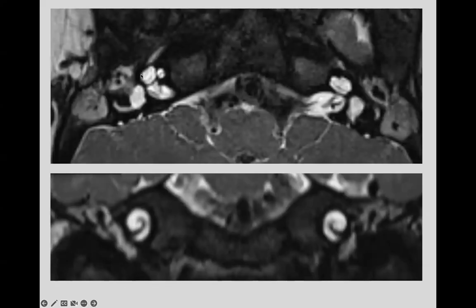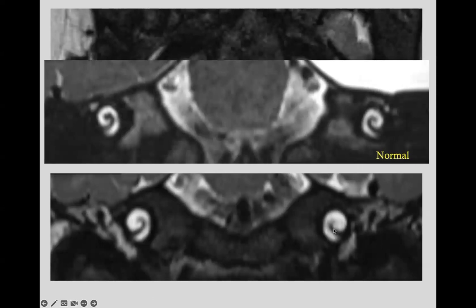Again, another case, smooth lateral profile, empty upper part of the cochlea. Look at the difference on the coronal, the spiral. Here, this is a coronal. This is normal. Look, here something is missing. So remember, that's very important.